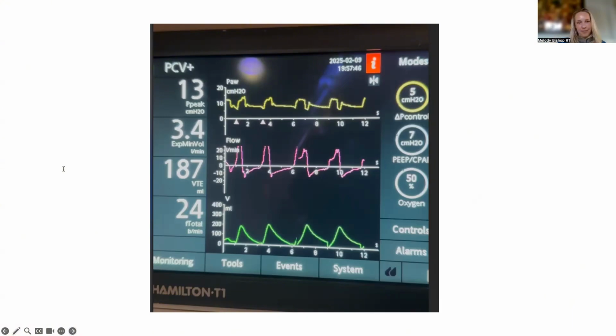All right. Since this is an ICU thing, this is really interesting. This is my turn to ask you, Nick. Again, you can't see all the settings, but the inspiratory time on this patient was 0.9, a normal inspiratory time for an adult patient. And this waveform screen was sent to me for some advice because it was a difficult to ventilate patient. What are your thoughts?